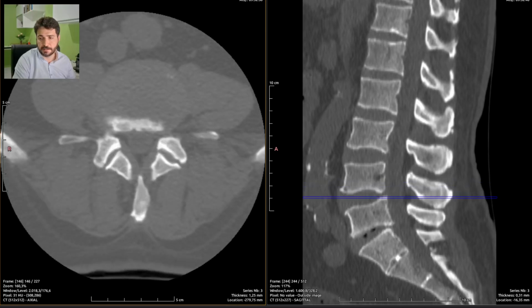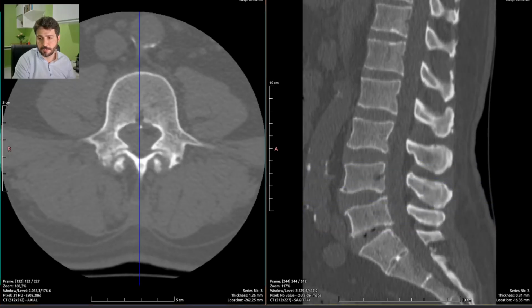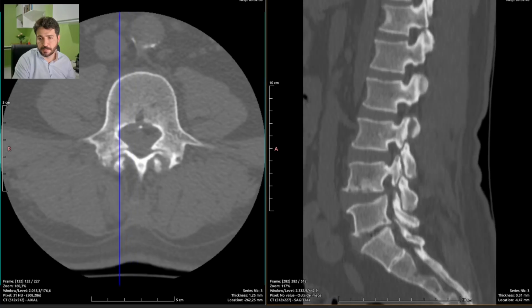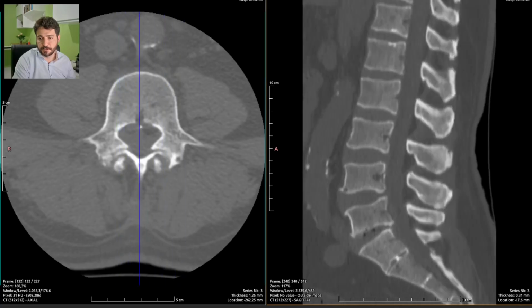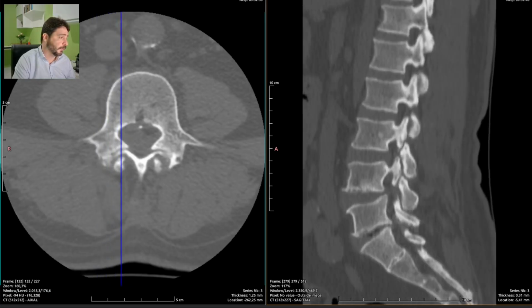So this is classic arthrosis, moderate because there is already some degree of deformity. This isn't just mild, this is moderate. So let's go. I have done that. I'm just going to report the spondylolysis.